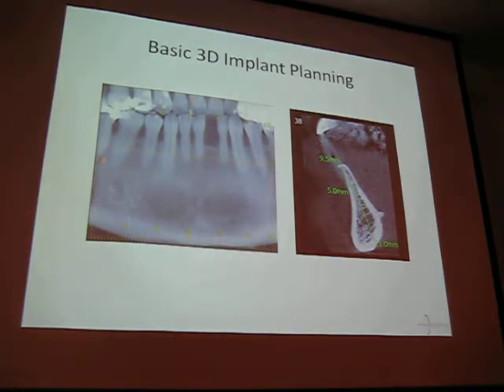And what I do, and what I think you should ask for if you're sitting somewhere, is I'll measure at what point we're at least 5 millimeters wide. Because if you have 20 millimeters of bone until you hit the nerve or sinus, 20 is probably not realistic, but if you have a sizable distance, but the ridge comes to an apex, you're not going to place an implant right up to that point. Right? You need a certain width. So we'll measure down to the minimum.